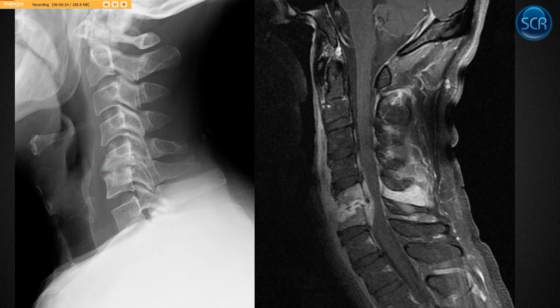This is spondylodiscitis. This is destroying the end plates. This is very destructive. So it has the destructive features of a neoplasm, but it's centered on the disc. So this is infection. All right, so spondylodiscitis. And you'd expect there to be a big, maybe retropharyngeal abscess or swelling or something. There just doesn't happen to be in this case, so not helpful there. But this is what spondylodiscitis looks like in the cervical spine.